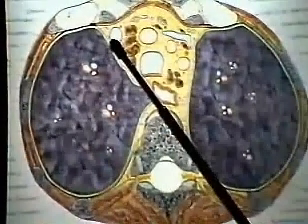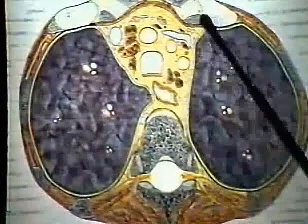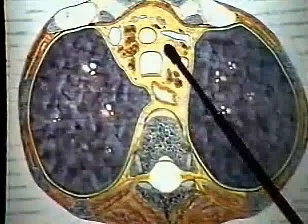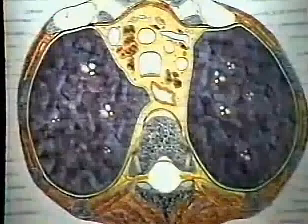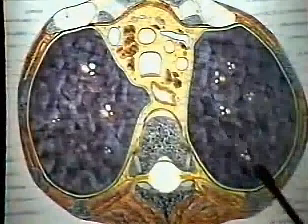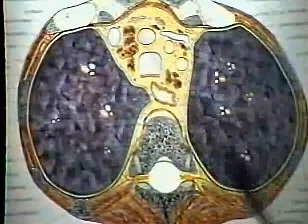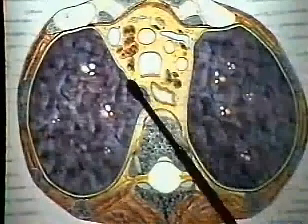In this case, we are still at the level of the right brachiocephalic vein, and over here, the left brachiocephalic vein, which is just beginning its course in front of the root of the great vessels. The great vessels themselves, 1, 2, 3, are the standard anatomic pattern that we would like to look for. We like to see the subclavian artery, which, as we said, will be the border-forming portion of the left side of the mediastinum high up, a somewhat smaller common carotid artery, and a brachiocephalic, or in the old nomenclature, the innominate artery.